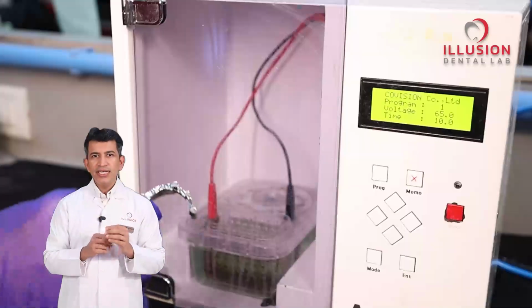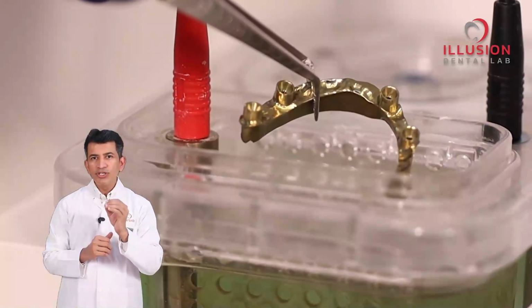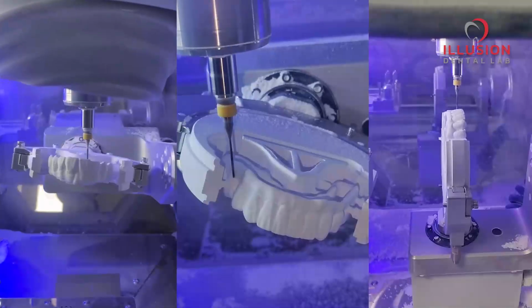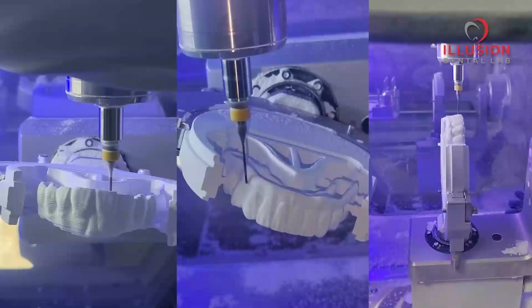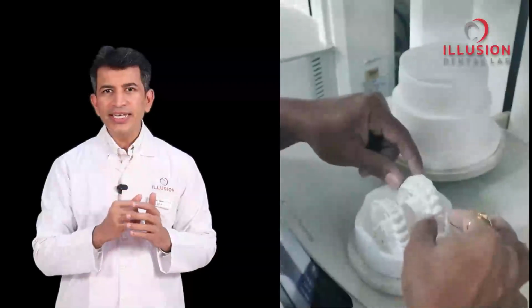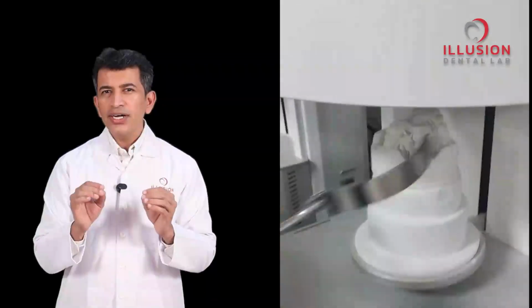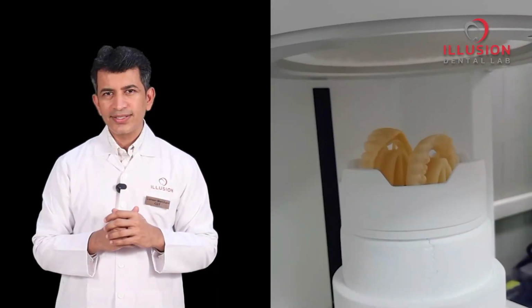After minimal finishing, it is anodized to its signature gold finish for compatibility, corrosion resistance, and aesthetics. A PMMA trial is sent to confirm fit, aesthetics, occlusion, and comfort. After approval, multi-layered zirconia milling is performed using 5-axis CNC machines where complex geometries are milled with extreme precision. Once milling is done, the sintering step takes 16 to 18 hours where zirconia is heated at 1550 degrees centigrade to achieve incredible strength and natural aesthetics.